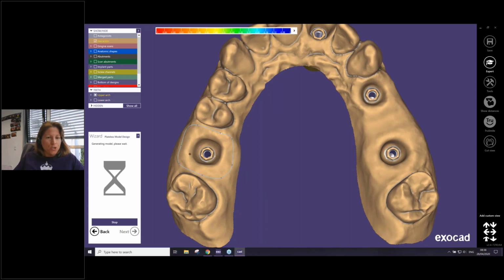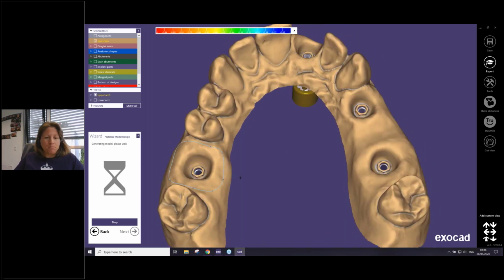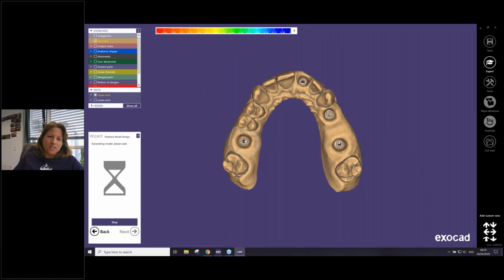And important to know, to choose different settings, which we'll do right now, it's mandatory that you have designed abutments before. If you don't have the abutments designed beforehand, it's not available in this step. That's important to know. But also here in the Plovdiv release, there's one nice option available. If you have designed the abutments, you can create, for example, an abutment die. We will do it in the anterior part. We can select this one as an abutment die.